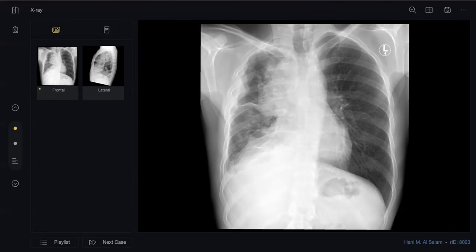I would review the previous images if available and check for history of occupational exposure to asbestosis, although I cannot see any pleural plaques to suggest that, and then ask for a chest CT to confirm my finding and refer afterwards to the relevant MDT.